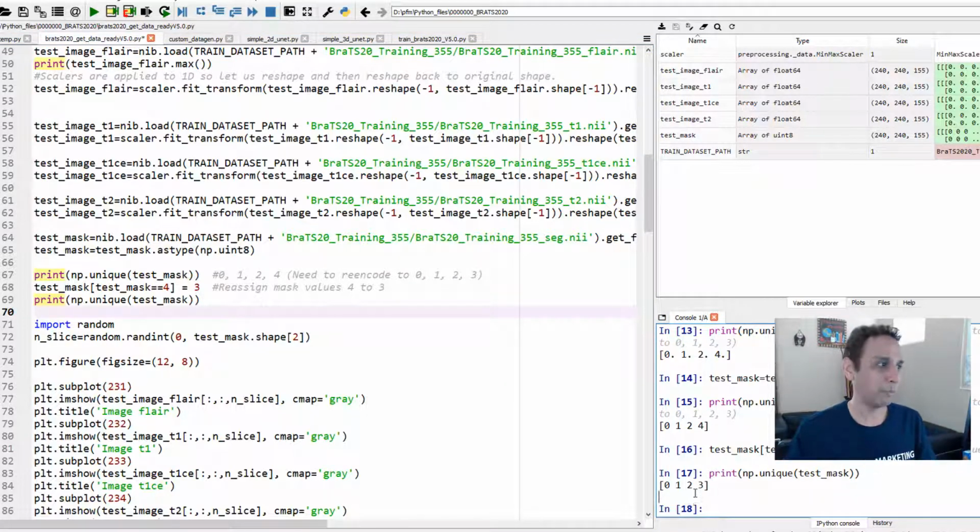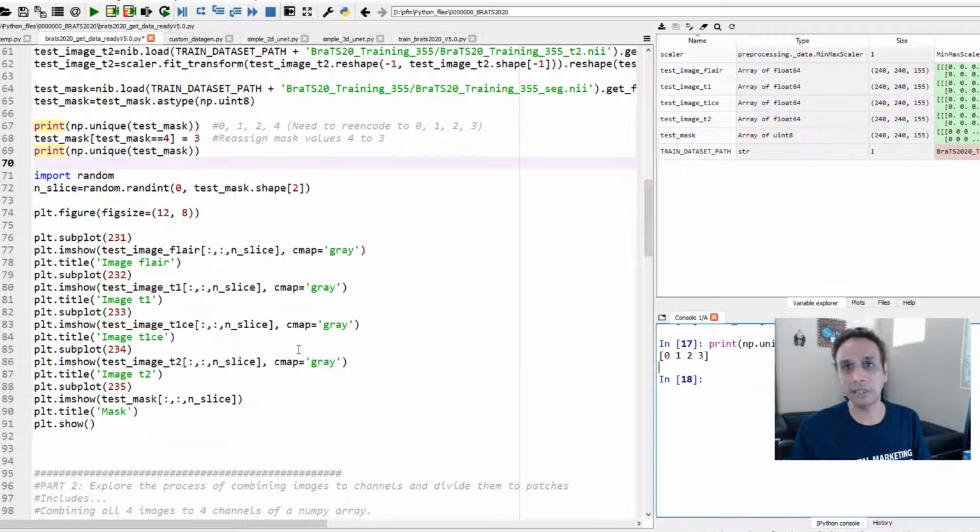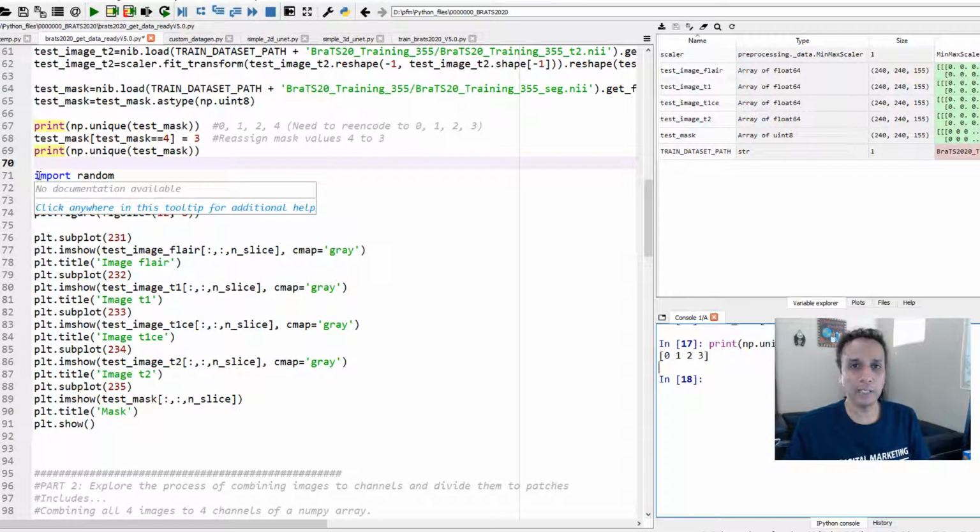Again, most of you may think, hey, stop dwelling too much time on the basics, but the viewers of this channel come with diverse skill sets, so sometimes it helps to cover these basics. So we are trying to understand a single image, and we did all of that to get the image ready. And now let's look at a few planes.